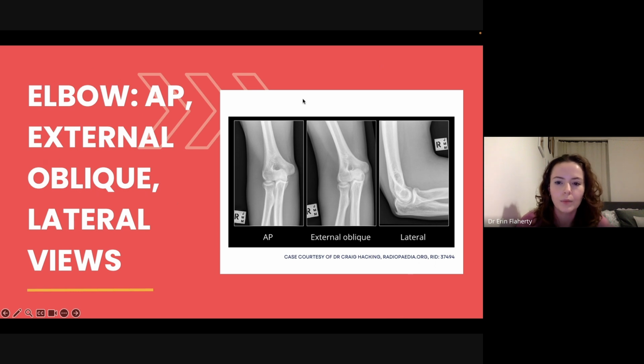And then we've got our elbows. So as we said earlier, we've got our radial head here, which looks like a little bit of a golf tee, and we have our ulna, which goes all the way back with our olecranon behind, and that joins up to our humerus, and these are our condyle bones just at the top, well, our condyle processes.